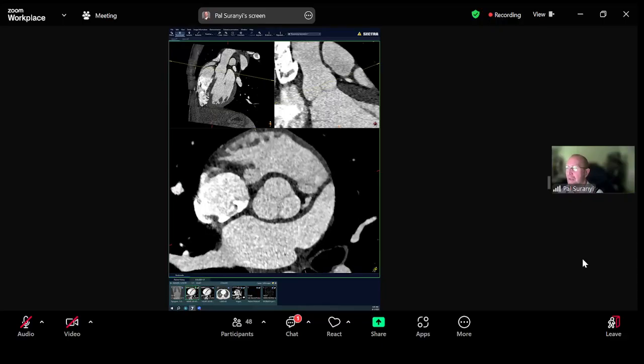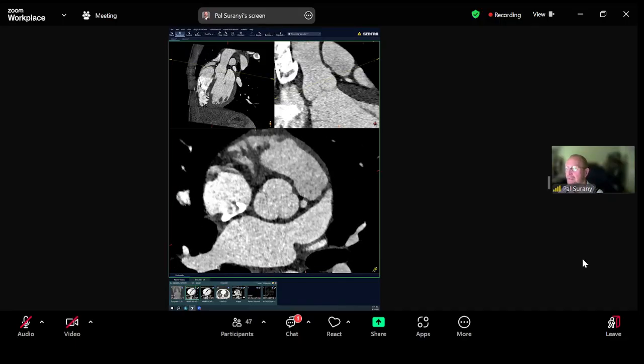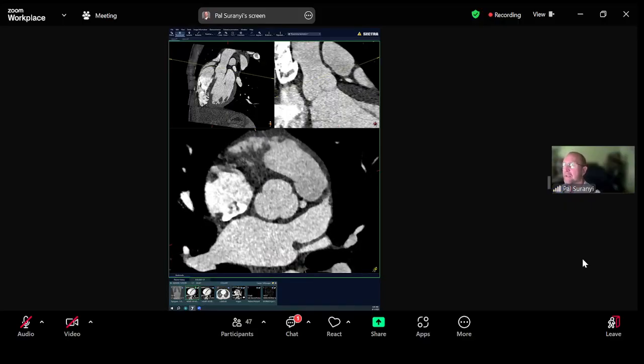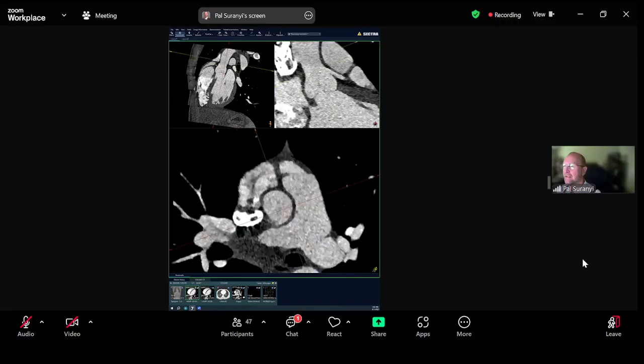As we would expect, the non-coronary sinus is straddling the interatrial septum here. The right coronary sinus is facing anteriorly, and the posteriorly and leftward facing sinus is the left coronary sinus of Valsalva. These three sinuses comprise the aortic root. Then we have the sinotubular junction, where the sinuses end and the aorta gets a little bit narrower. Above that, we would be looking at the ascending aorta.